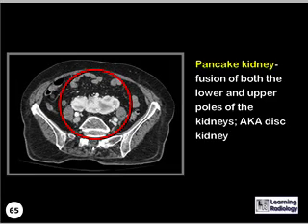This is a pancake kidney, which involves fusion of both the lower and upper poles of the kidneys. It's also known as a disc kidney. What sign is this?